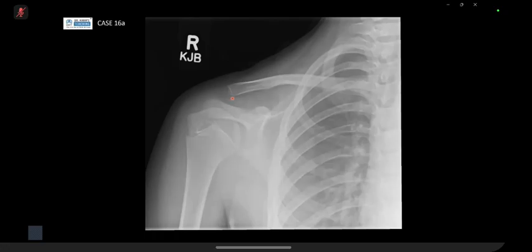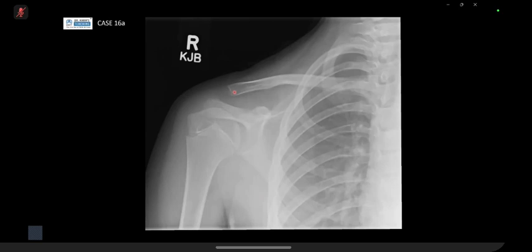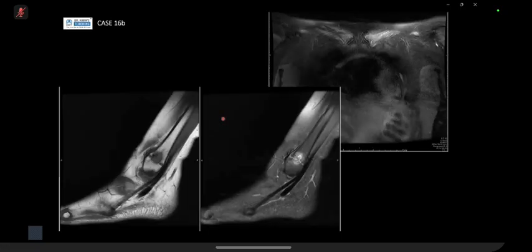I think that happens very infrequently in children, and what happens is that you actually get a avulsion fracture of the distal clavicle, and then subsequent to that you can get a very large periosteal hematoma, making it look a bit like malignancy, okay? But then MRI will help you clarify it, but just remember your acromion ossification, I don't think it starts to form until you're in your early 20s, or late teens. It's why you never see the acromion.